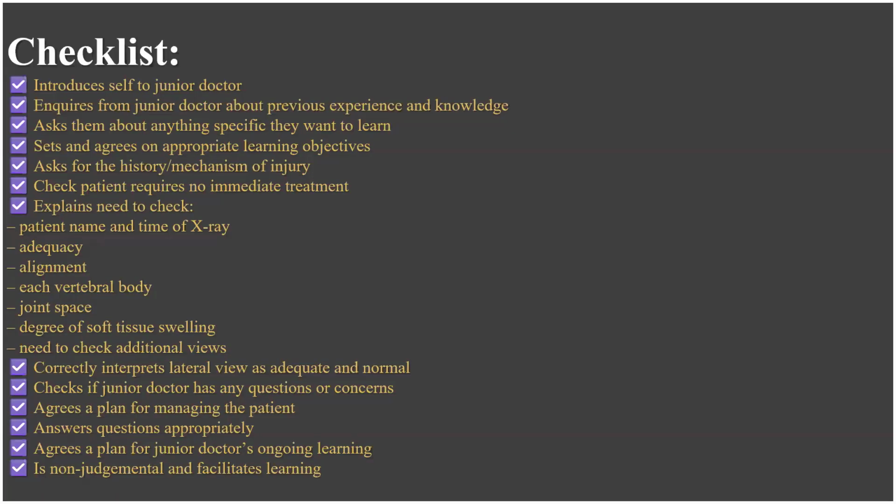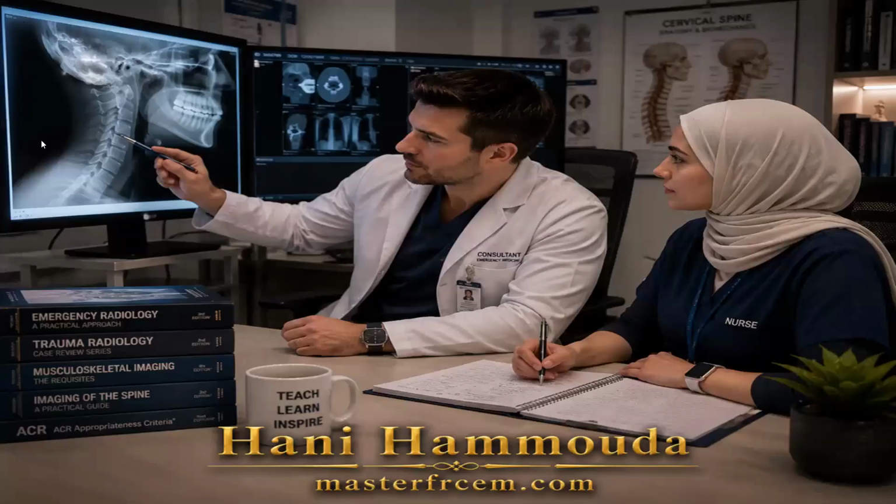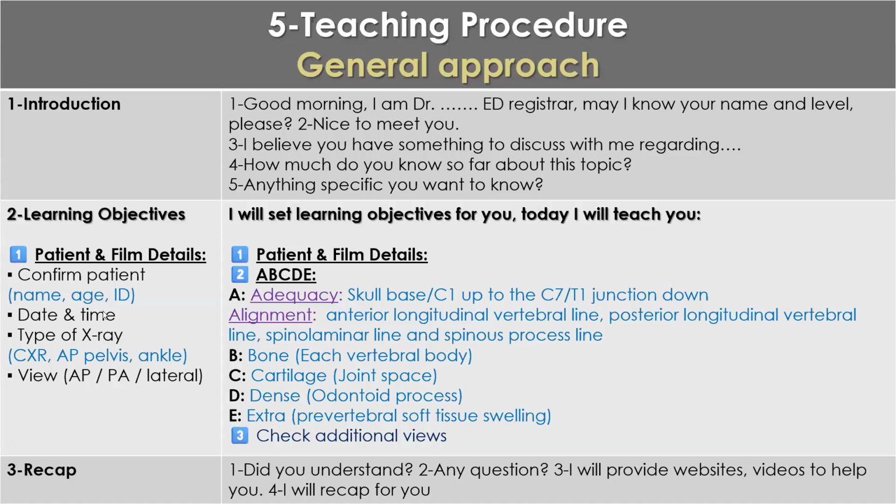So this X-ray, for example, do you have any name here? No, sir. So not accurate. Do you have a date? Do you have the name of X-ray? They shouldn't put here lateral cervical X-ray. They should put lateral view. They should put the name of the patient, the time, the date. If you find this information, it's called accurate. If not there, it means not accurate. So I want you to mention the normal and the abnormal.